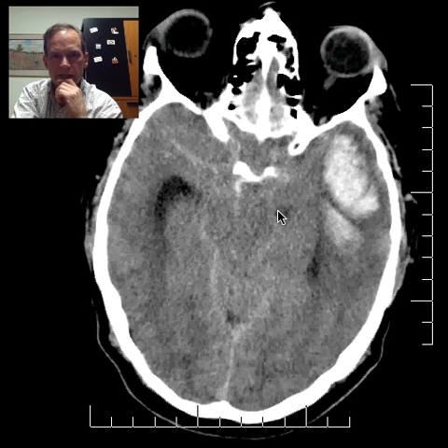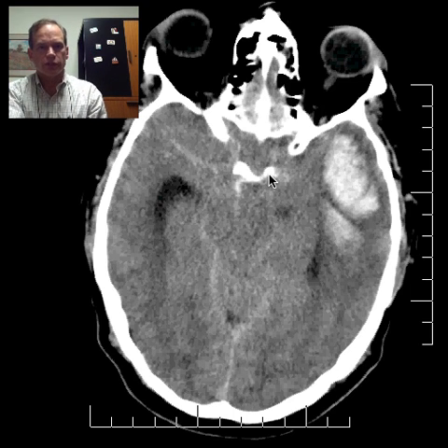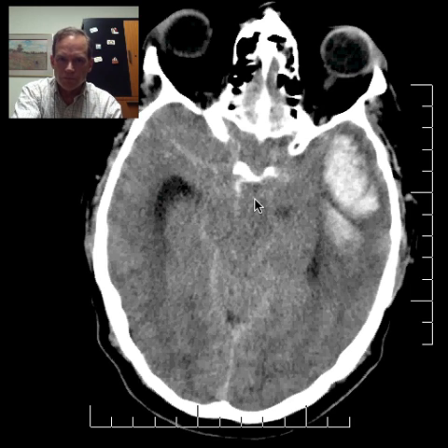And it can be hard to see that, but if you look here, what do we have? This is the sella turcica. This is the dorsum sellae. This is the dorsal aspect of that saddle-like structure, the sella turcica. And so this is midline here. Well, if you drag something from that to here, you can see this temporal lobe is much closer to the midline than this one.